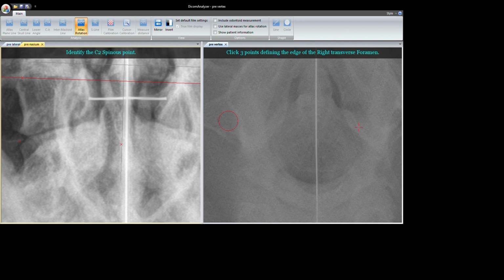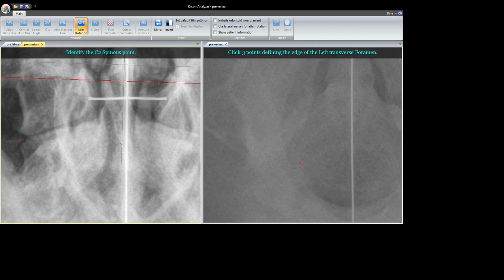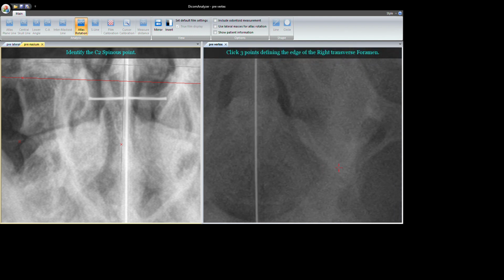If you want to leave a command at any point and not finish it, you press the escape button, and that takes you right out. What we're going to do is I'm going to bring this up, get that a little brighter, and I see an edge right down here. See the top of the circle right up here. I'm going to bring that out to the other side, and that should be one side.